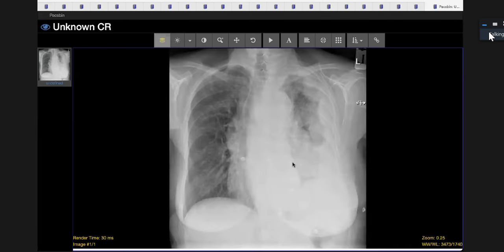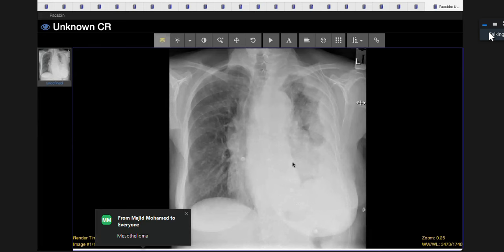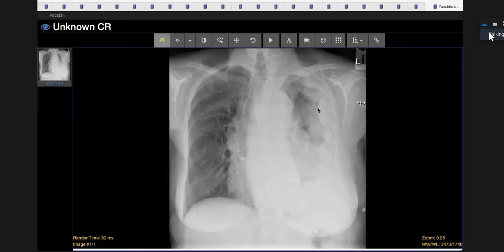So, shall I present? This is the frontal radiograph of a skeletally mature patient. Quite a few abnormalities going on in the chest X-ray. I'll just take a brief moment. The left lung field is grossly abnormal. I see multiple radiodense opacities, some of which are pleurally based towards the periphery.